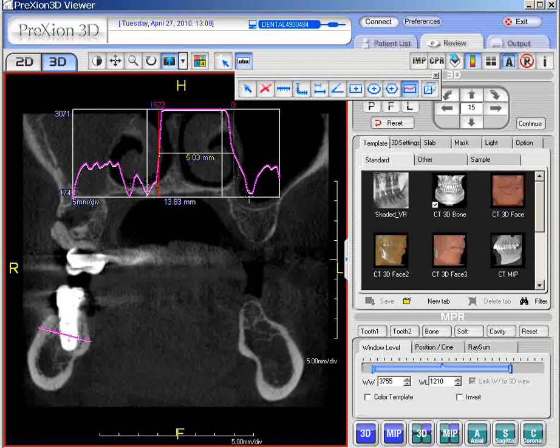So this is all that we're saying here: you have a linear line, and you can judge the profile of medium dense, less dense, medium less dense, very dense, and then out through the cortical bone, medium dense as well. So that is the feature of the profile key.